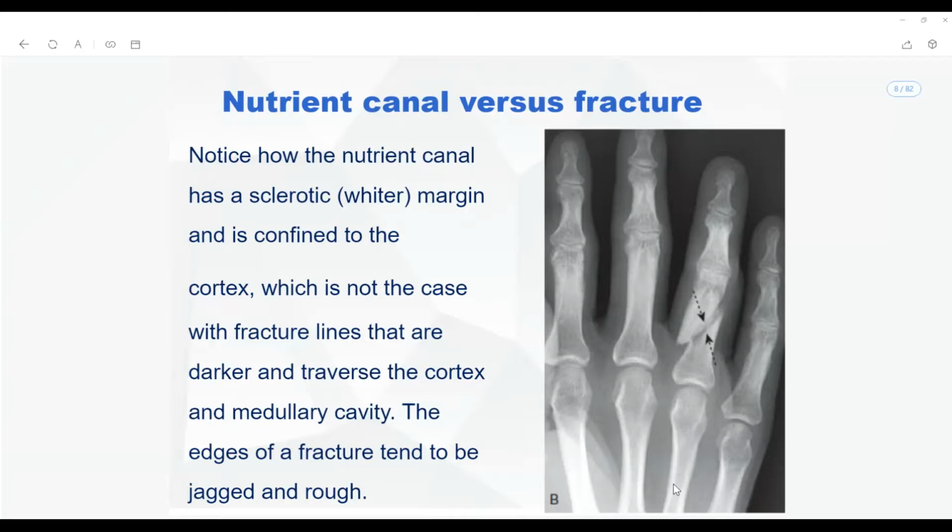So there is a fourth phalanx proximal bone fracture. Yes or no? The proximal phalanx of the fourth finger has been fractured, right? All of you are not even listening. When I asked you a question, if this is a carpal or a metacarpal, I'm just asking you and expecting an answer. You have to tell me, sir, you are not talking about the phalanx. Don't answer, only choose from carpal or metacarpal.